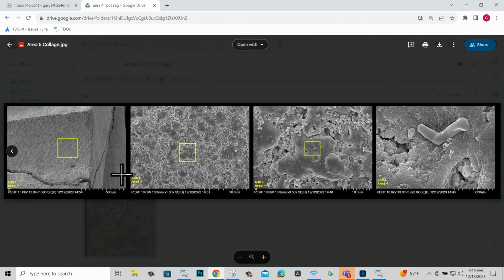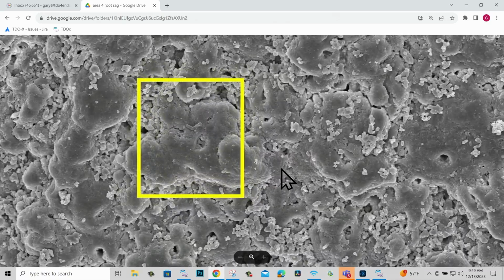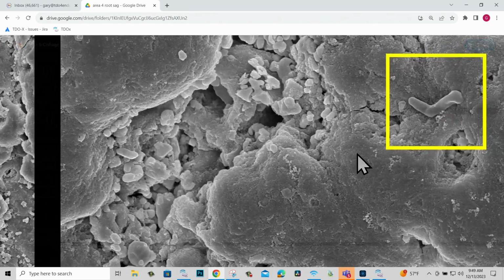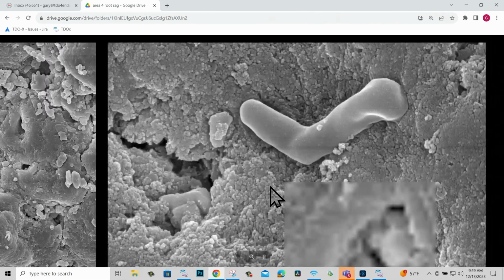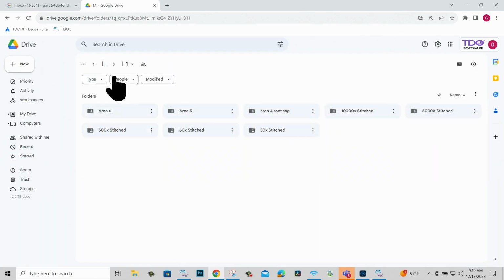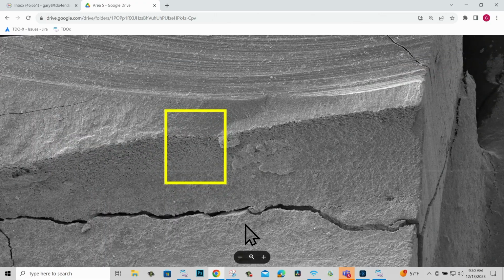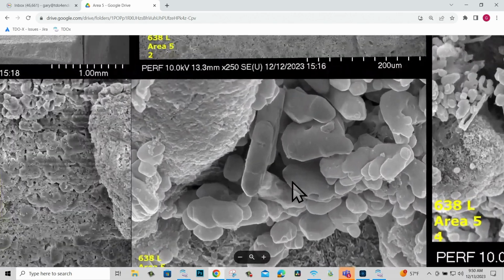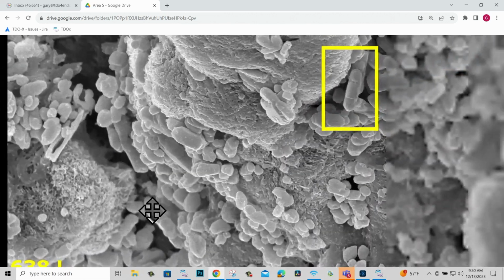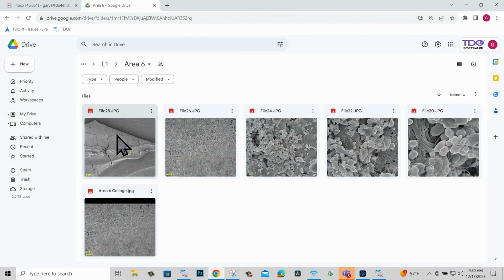If you go into some of these areas, especially up near the top, you can see there's been quite a bit of demineralization of the predentin. And there's what I'm interpreting as an organism. But for the other debris, there's just uncertainty. I can't really tell whether this is calcium hydroxide or part of the demineralization of the predentin, which leaves debris like that as well. There you see kind of a barrel shape that we talked about in the earlier video that's reminiscent of streptococci.